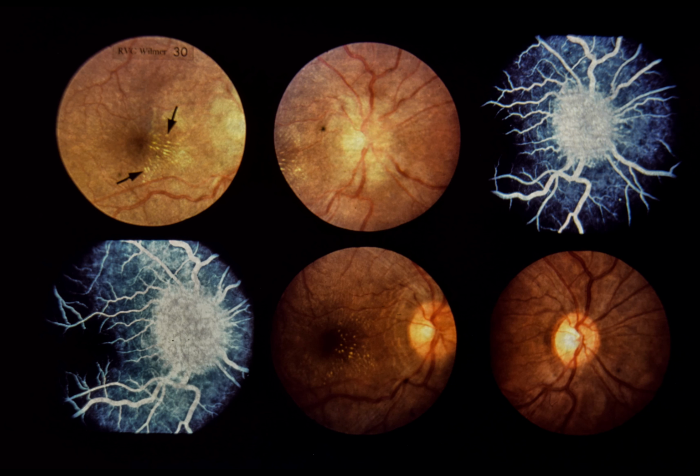However, in these patients, fluorescein angiography demonstrates no retinal vascular abnormalities in the macula, indicating that the macular star is caused by leakage from disc vessels and that the process is a primary optic neuritis and not a primary macular disorder. Except for a history of viral illness preceding visual loss, as in this patient, we are not aware of any other associations.